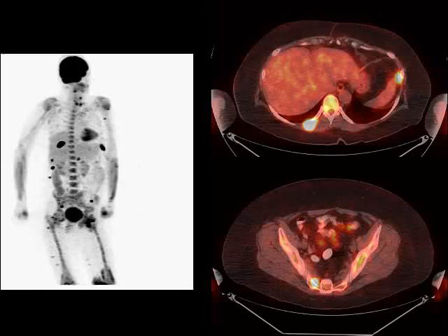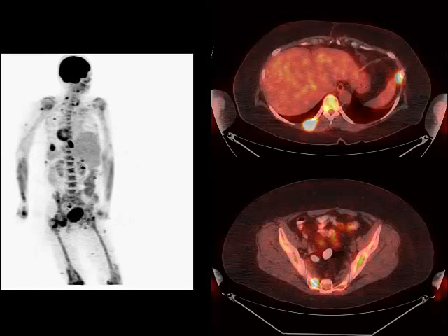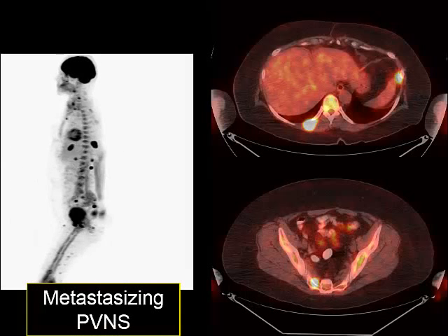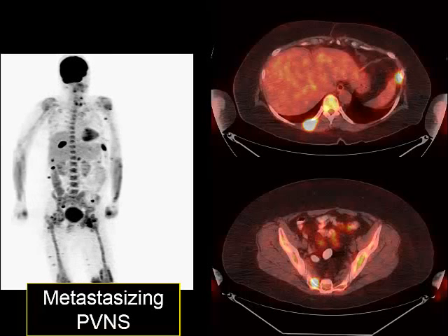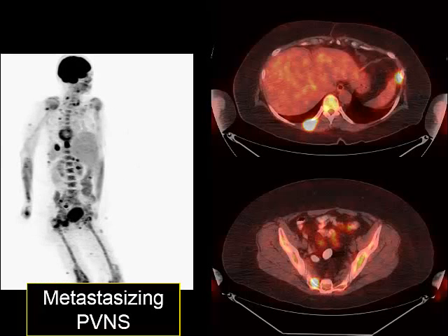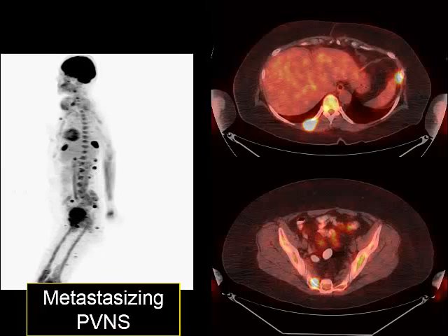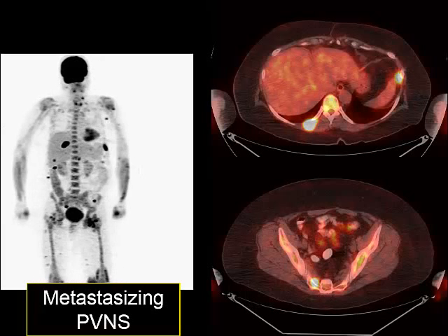So we can see here in the presacral space, posterior chest wall, lateral chest wall. And these were eventually biopsied and proven to be metastasizing PVNS. So we see these rare cases of what would classically be considered a benign tumor, but now that we understand this underlying clonal population, we can understand that sometimes these can develop a component that can indeed become metastatic. So this is metastasizing PVNS.